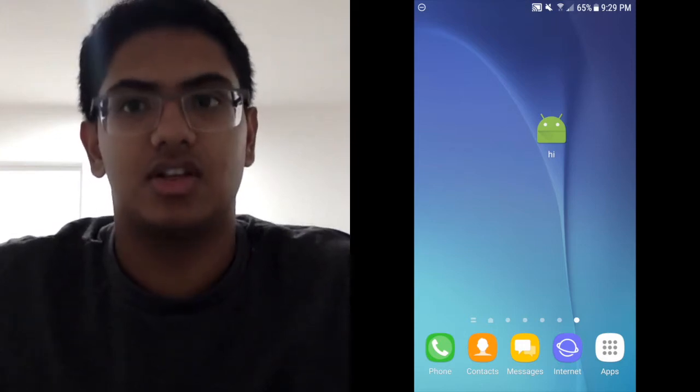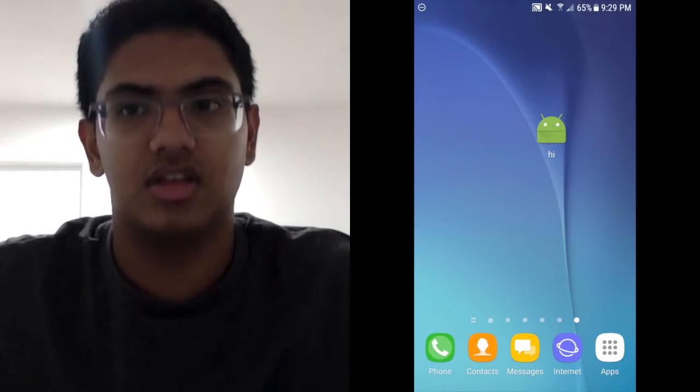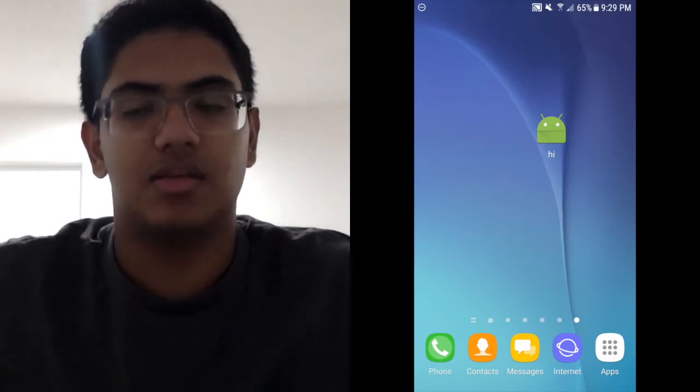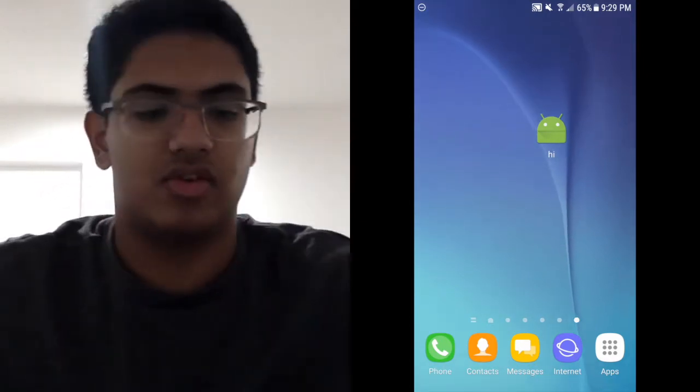Hi, my name is Chris Marchundi, and today I'll be presenting our app which detects symptoms of neurodegenerative disease like Parkinson's. I created the app alongside my teammates Sanjeev Prasad and Jeffrey Zhao, and here I'll be running the app on an Android phone for my demonstration.